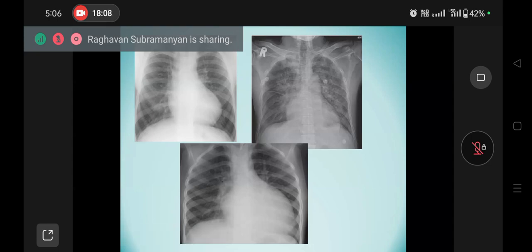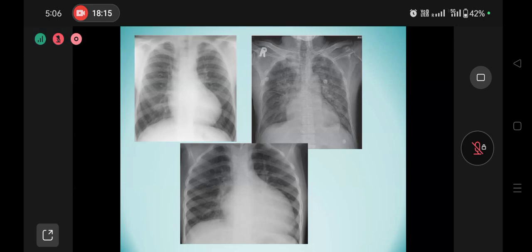Probably you can opt for whichever looks dominant, and it may indicate biventricular enlargement, but you cannot be 100% certain. Pure left ventricular enlargement may also produce that appearance. The configuration just gives you a clue to possible ventricular enlargement. Okay. Now there are more definite clues to ventricular enlargement that we will discuss in the next few slides.